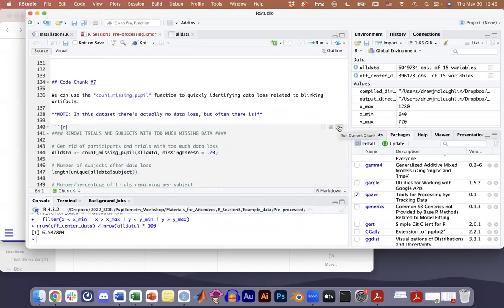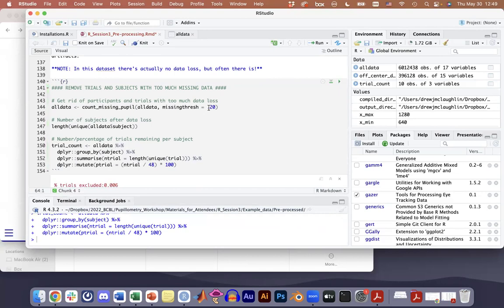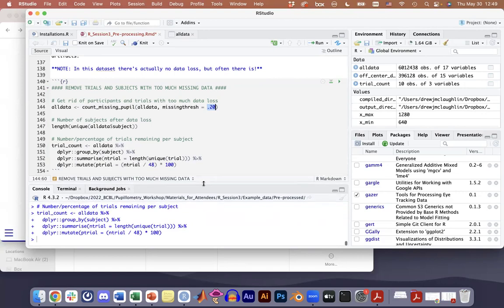There are also cases where a data set is pre-collected, and so you aren't going to be able to collect more data. Okay, so I'm rerunning this function with the higher threshold, which still is quite low, just to clarify.